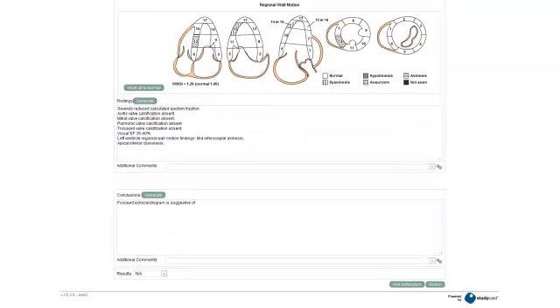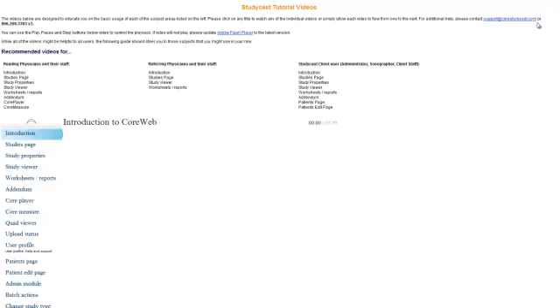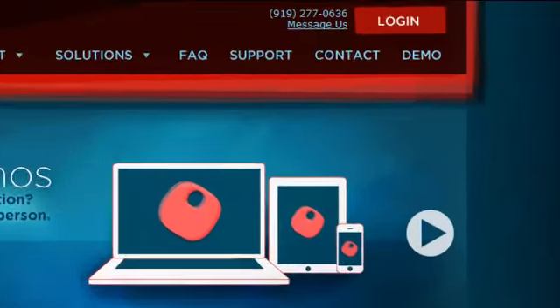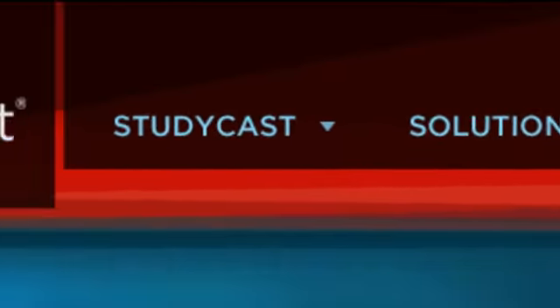This has been a brief overview of the features you will be likely to use. However, if you need any further assistance, you can find a full suite of in-depth Core Web training videos at corestudycast.com. Or you can contact Studycast support at 919-277-0636, and we will do our best to help you with any and all questions you may have.